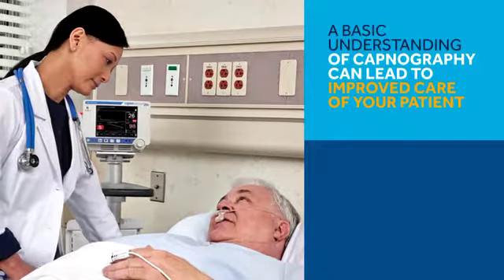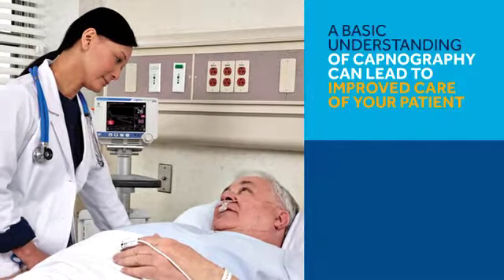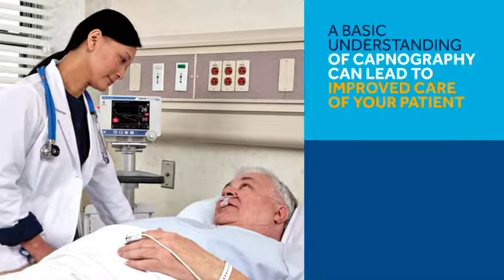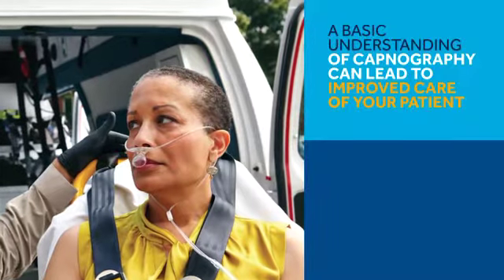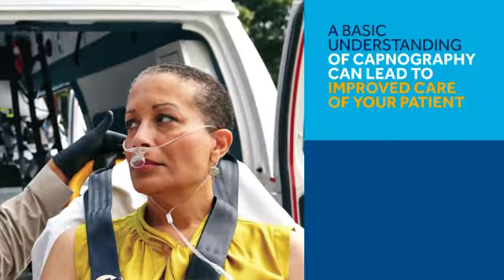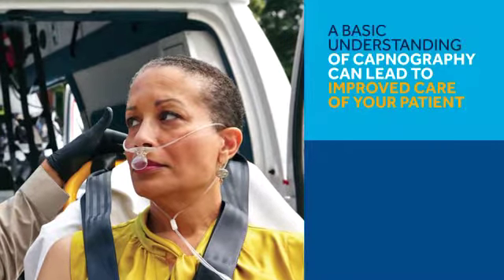Representative CO2 waveforms are a critical component in the clinical application of capnography. Your understanding of the basic principles of capnography and of normal pulmonary physiology will help you to interpret these waveforms properly, leading to effective and timely interventions and successful clinical outcomes.